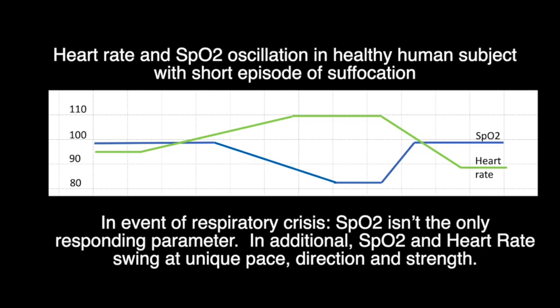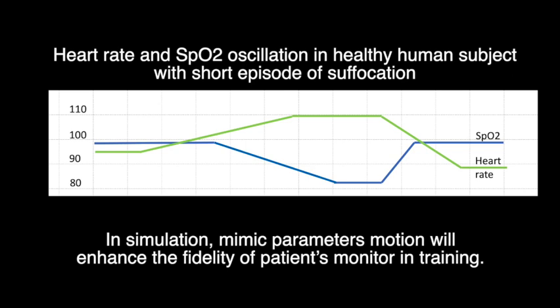This video clip illustrates that in events of respiratory crisis, SpO2 isn't the only responding parameter, and SpO2 and heart rate swing at unique pace, directions, and strength. In simulation, mimicking the parameters' motion will enhance the fidelity of patient monitors in training.